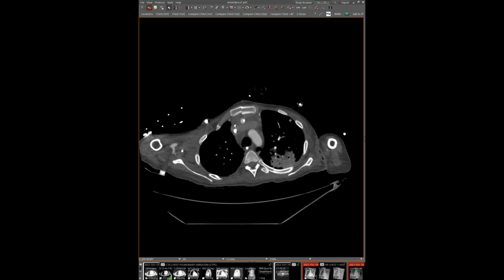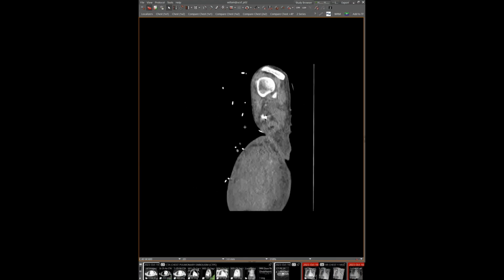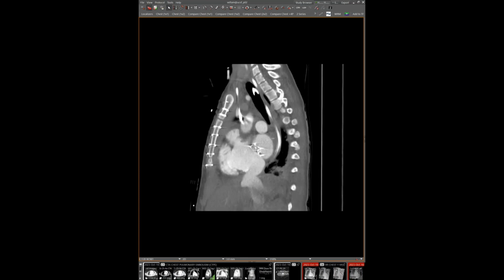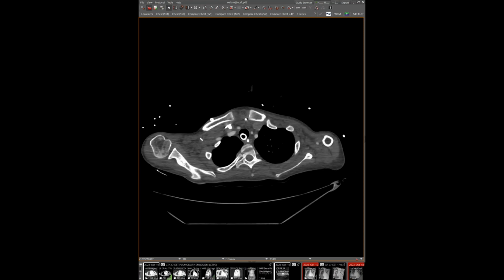And the other thing that is worthwhile knowing about that is that in a patient that recovers, they remove the Impella, but the synthetic graft that they use to put it in remains. And if you just happen to read a post-removal CT and you see another tubular structure in the superior mediastinum that doesn't make any sense, that is the potential explanation.